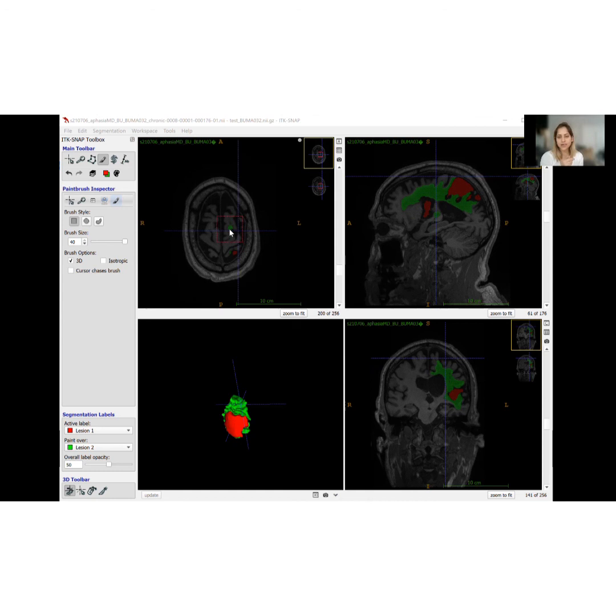In this specific case, you have 2 labels, so you ended up with 1 and 2 for the 2 colors, and then 0 elsewhere. So we might want to unify the 2 labels to 1 lesion map with the values of 1, like a binarized map. So that's how Isaac found how to do it. Exactly. Thank you for that very clear explanation, Tamar.